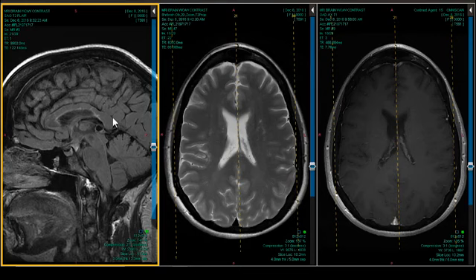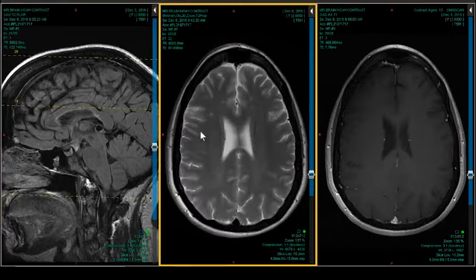And the other syndrome that always comes up, when you have these periventricular and callosal white matter lesions, is vasculopathy from vasculitis or simply from small vessel disease. But I almost never have trouble differentiating the strong MS-looking disorders from these vasculopathies, because the vasculopathies are pretty random.